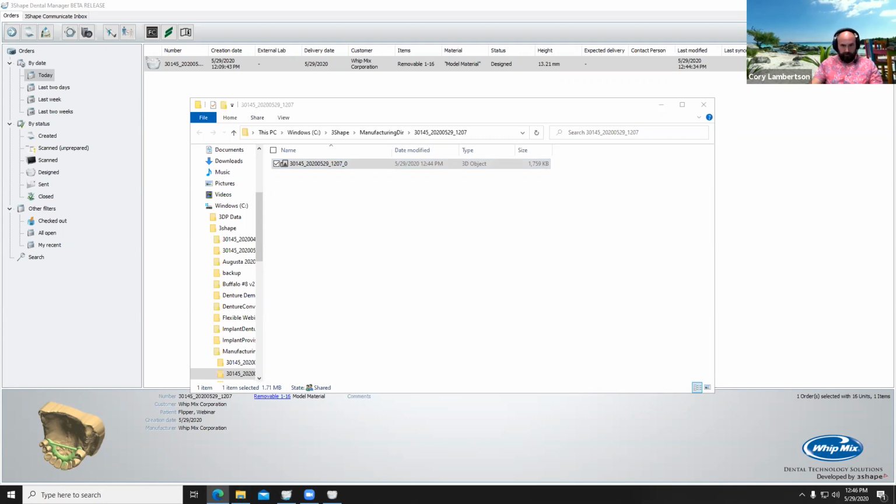I think Simo went ahead and commented in regards to your question on the intaglio. It's the seal in the palate, and he said if you get a digital impression, you'll need to do this. So if you get an intraoral scan, you will have to put that palatal seal or that bead line and digitally place that using the Sculpt tool. You're going to do that under the prepare stage, which would be the same stage where Bryce segmented or removed the tooth to create the flipper. That's where you would add that in at that point in the design.